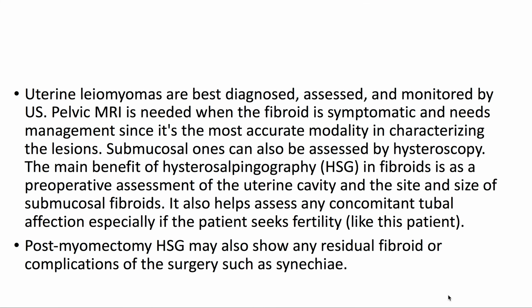Uterine leiomyomas are best diagnosed, assessed, and monitored by ultrasound. Pelvic MRI is needed when the fibroid is symptomatic and needs management, since it's the most accurate modality in characterizing the lesions. Submucosal ones can also be assessed by hysteroscopy.